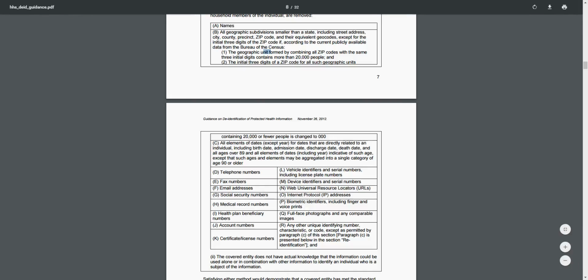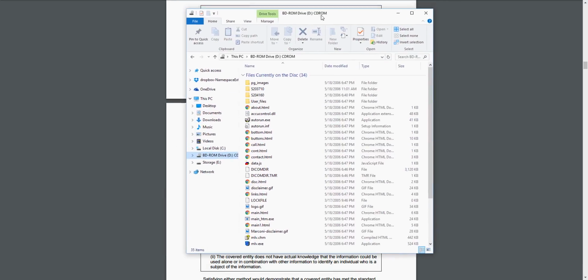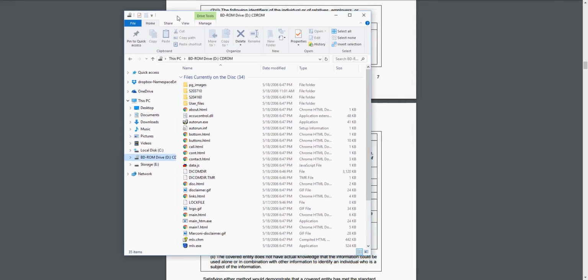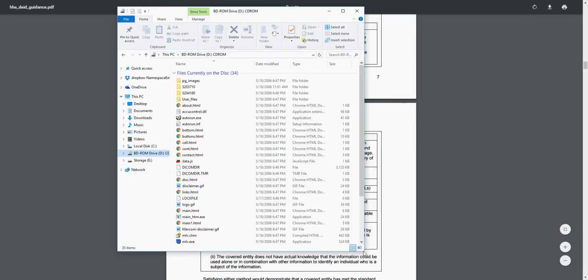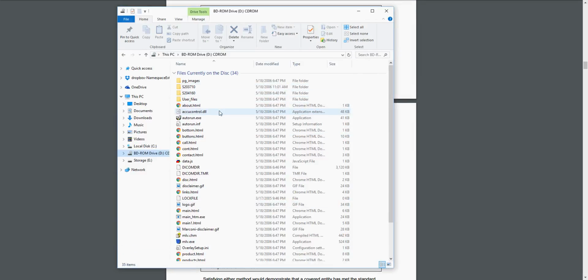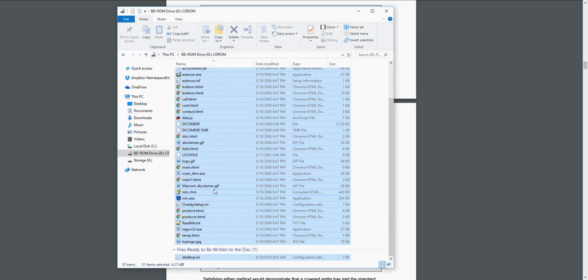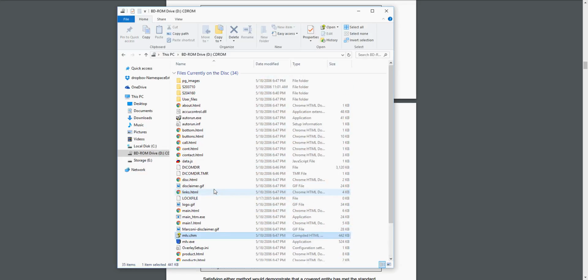So let's look at some data. Here's a scan I got a long time ago of my feet. This is typically how you'll get it, as a CD. And this has a bunch of other files here which we don't really care about. These are basically part of the program that is on the CD to load and view data. I don't typically bother with those.